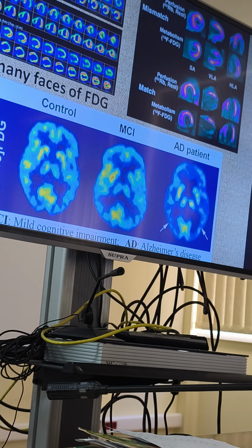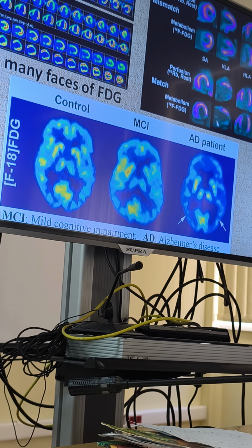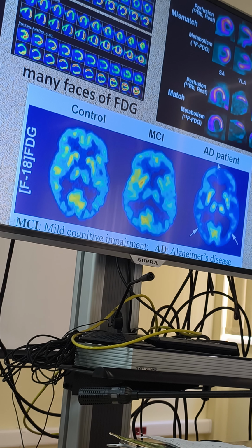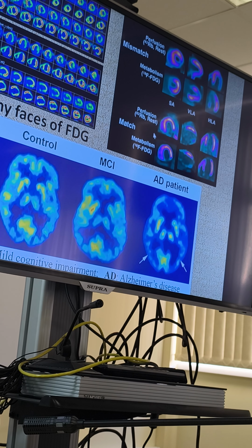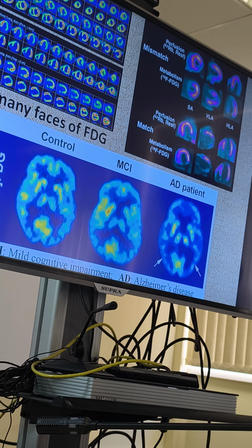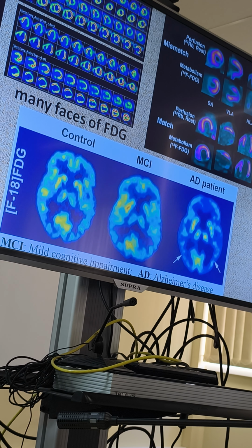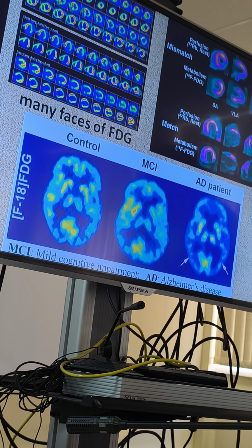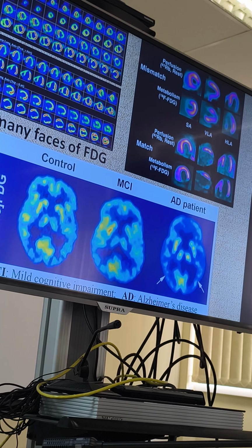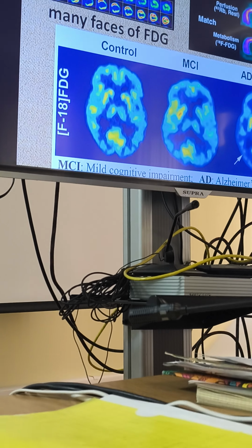But in another patient, we see something like this. No perfusion, just half of the horseshoe, and no sugar uptaken. What does it mean? That they are both bad. We say match. This picture and this picture show the same thing. What does it mean? That this myocardium is not hibernated. It's not working at all. It's kind of dead. Probably it's fibrous tissue there, that doesn't like sugar. And what does it mean? That there is no sense in trying to place a stent there, because there is nothing to revive. And so this is how we can use this interesting idea in diagnostics of these people.